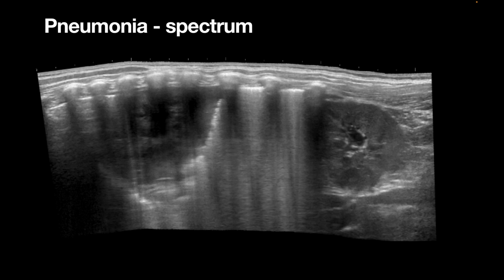Great picture because this explains what infection looks like on ultrasound. You may see a nice focal consolidation, and that makes it very likely that this is pneumonia in the right context. However, if you put the probe on and you see the B lines, it is a bit of a clue that this is like an inflammatory penumbra, an area of inflamed lung that's around a pneumonia.